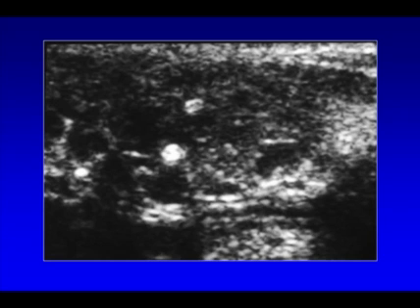When we did an ultrasound of this lesion, we found that there were dilated vascular spaces with bright echoes interspersed, which were consistent with phleboliths. When we actually did a Doppler of this lesion, we found no arterial flow, only venous flow. So this was characteristic of a venous malformation, and that gives an added extra bit of information to the surgeon to know what they're going to be expecting when they go in to treat this lesion.